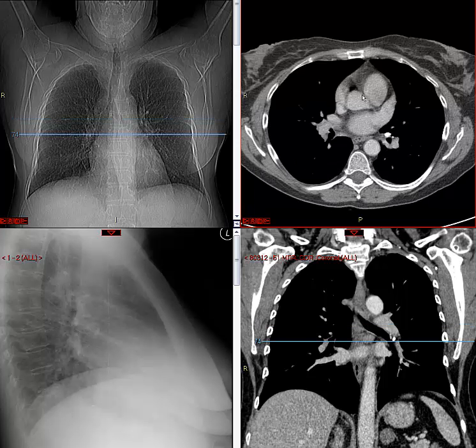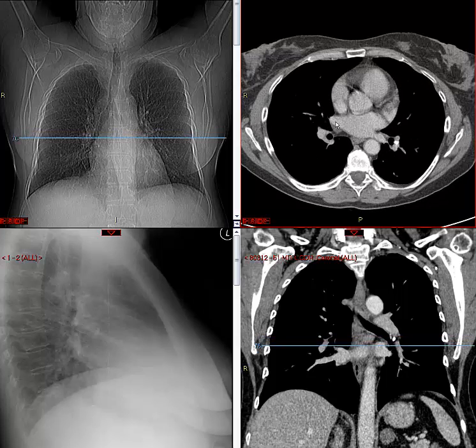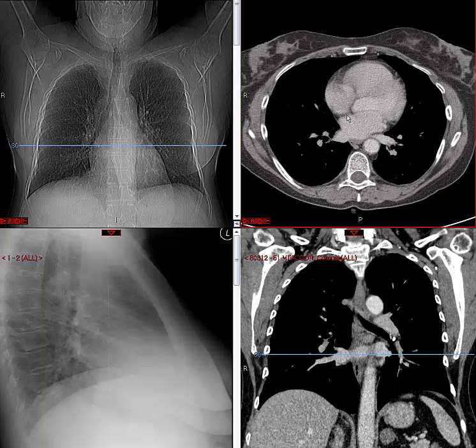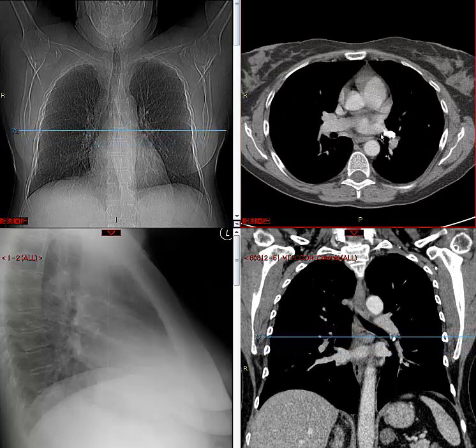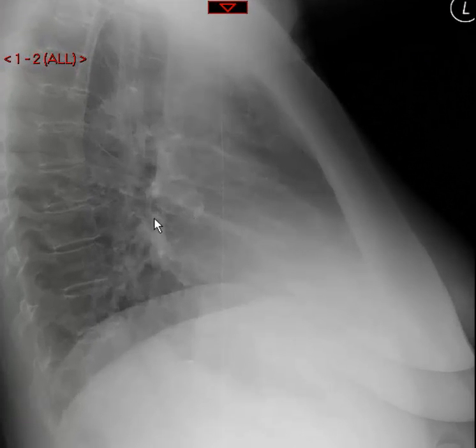Now blood's going to return from the lungs through superior pulmonary veins, inferior pulmonary veins. Here you see them on the right, emptying into the left atrium, which is here on the left. Then these are superior pulmonary veins, and inferior pulmonary veins emptying here into the left atrium. And notice how posterior this left atrium is. This is the most posterior chamber of the heart. And so if it's posterior, then when we look to the lateral view, the most posterior part of the heart will be that left atrium right back here.